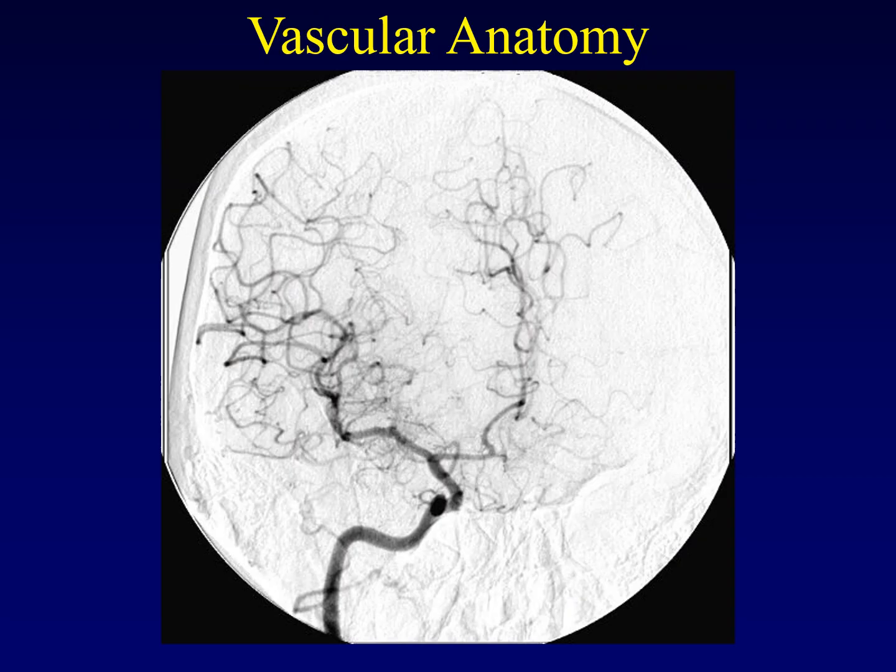Here's a digital subtraction angiogram like the one we were talking about earlier. This is a frontal, slightly oblique, but essentially a frontal projection where this is one orbit, that's another orbit. This is an injection into the internal carotid artery, and you can see the artery sweeping up through the skull base and up into the intracranial vault where it is supplying the arteries of the brain. Let's break this down a little bit and look at the individual elements.